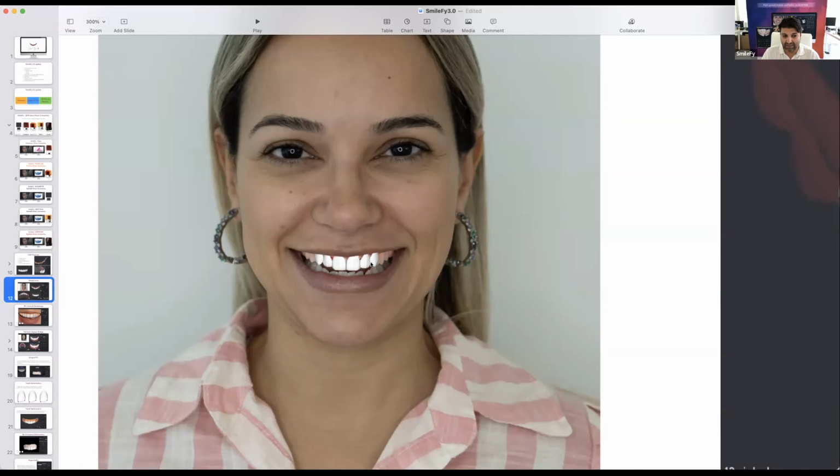So what I did was develop and research a way to display the 3D design in a very, very natural and special way, to be able to visualize the 3D smile before we go to print.